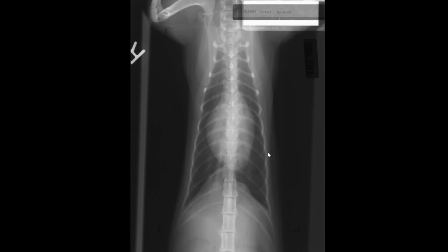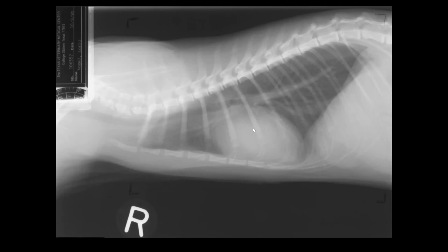So it's one of these things that if somebody put these radiographs in front of me and said, read these, and they told me that it's a young cat, I would say, yeah, the heart looks a little bit enlarged. And if he has a murmur, I would do an echo and see if there's a congenital heart defect. If I'm looking at this and I know it's a young cat, I'm not going to specifically say, yep, I see a VSD. I would have to do other tests to confirm that, but I might get a little bit of a suspicion that this might be a VSD.